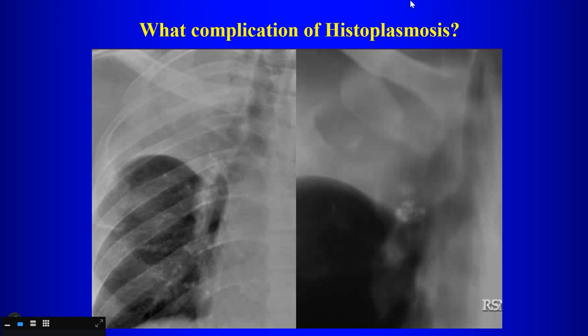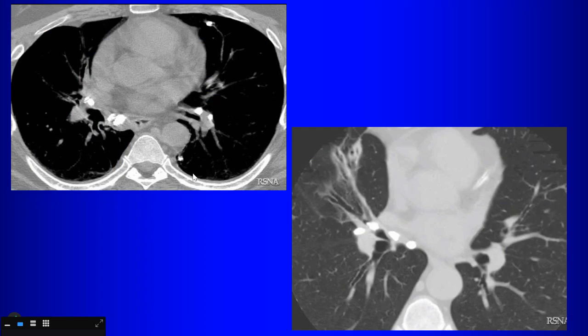Right upper lobe atelectasis. Yes, of course. What's all this opacity staring you in the face? That's right upper lobe atelectasis. Okay. Now in the tomogram, there is calcification. There you see it a little bit better on the tomogram, right? So calcified lymph node associated with right upper lobe atelectasis. We put that together by saying, go ahead. Broncholithiasis, right. So the lymph node erodes into the right upper lobe bronchus, causing right upper lobe atelectasis.